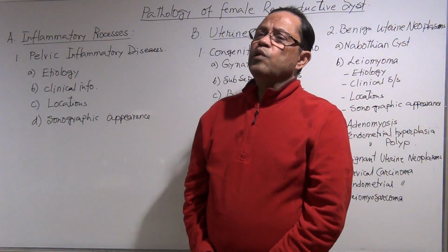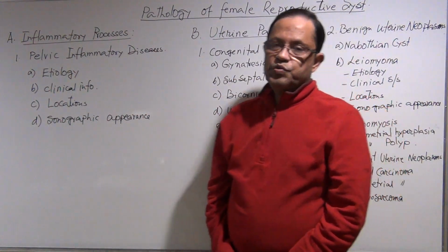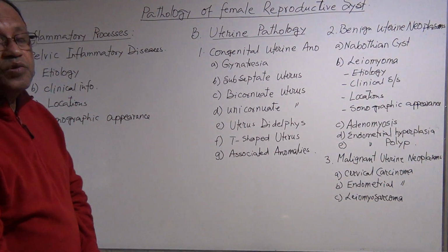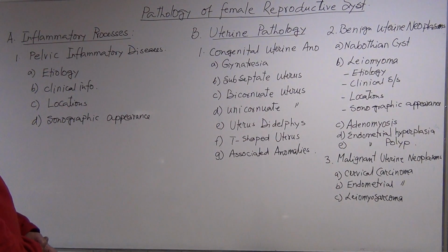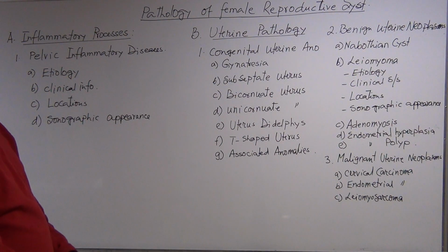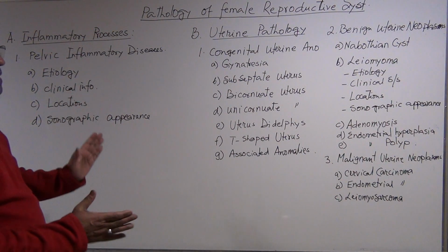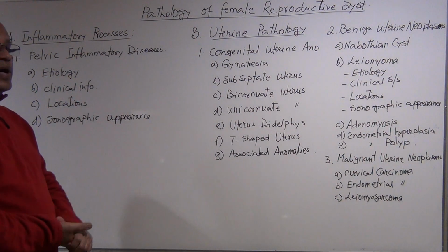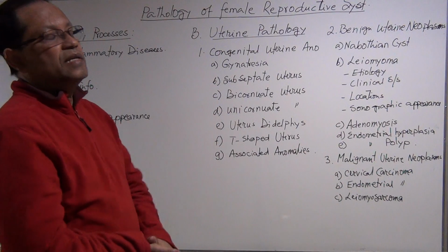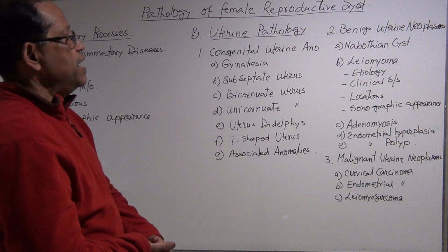Sometimes a structure may look cystic due to necrosis of the tissue, from any cause, maybe compromised supply of oxygen and nutrition, and some tumors can do this. It could be benign, it could be malignant. So these are the cystic lesions, where sometimes you will see multiple cysts, sometimes an isolated solitary cyst, and most simple cysts are benign in nature.